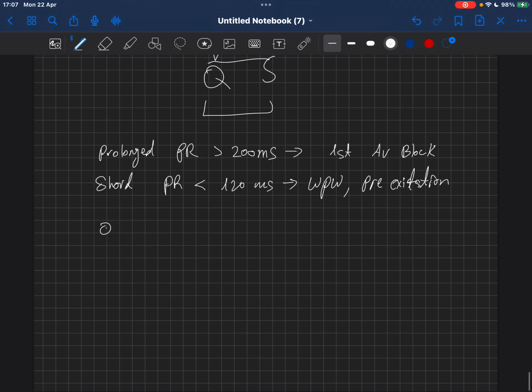Another interval that we can have is the QRS interval. QRS should be under 120 milliseconds. When the QRS goes above 200 milliseconds, it is known as wide complex ECG. Wide complex, no, not 200, 120. Wide complex QRS can be seen in many pathologies.